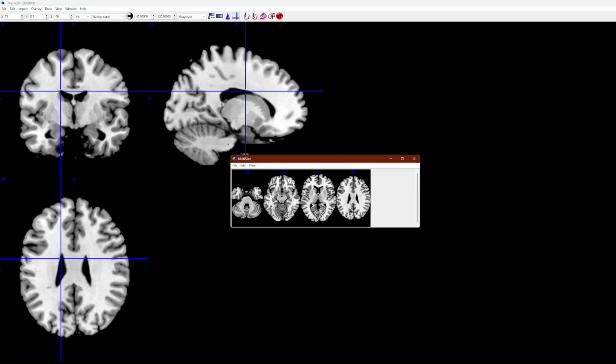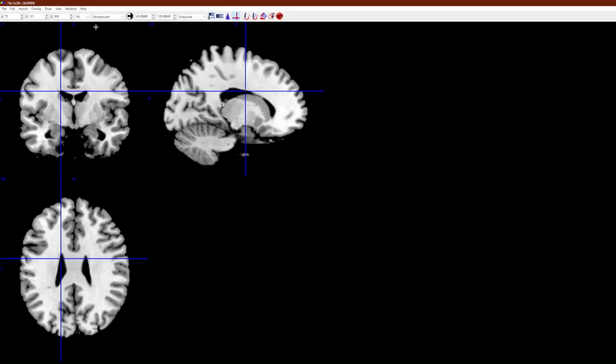You can set the range of slices, the step size, the number of rows, and as always, you can change the intensity and you can add the color bar as well, right here. So what about the histogram view?